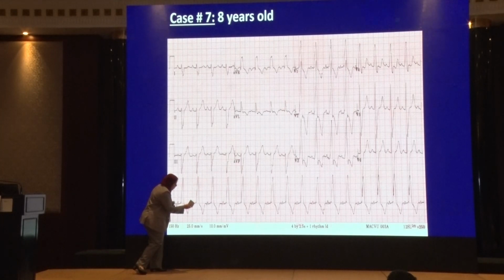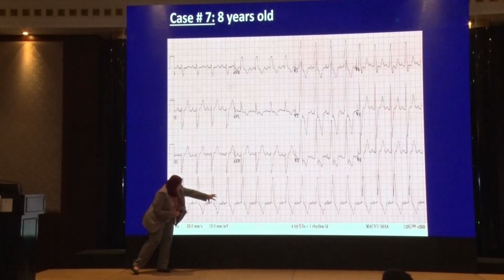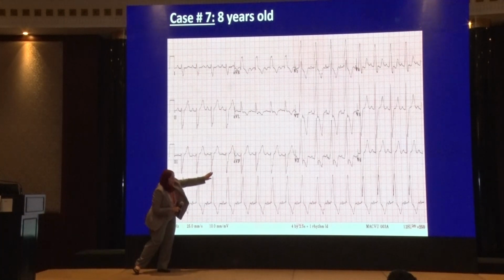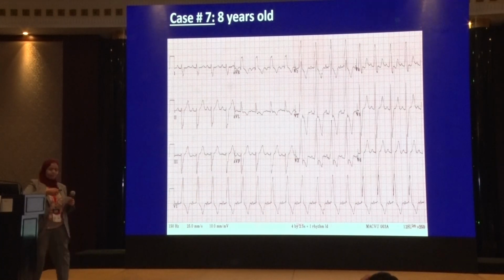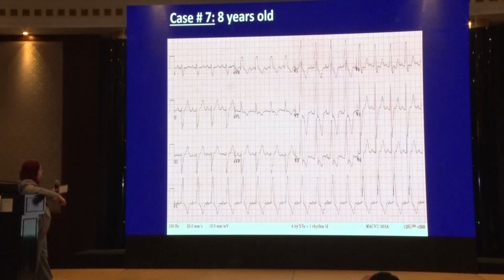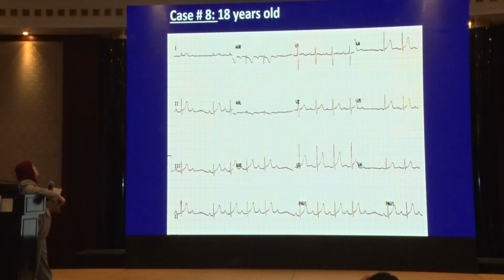Yeah, this is the R. As if the S is not there, and all this is R dash. So a very, very tiny R, and the QRS is wide, and we have a very high RS. Usually this is a patient we will see after cardiac surgery. So who will volunteer?